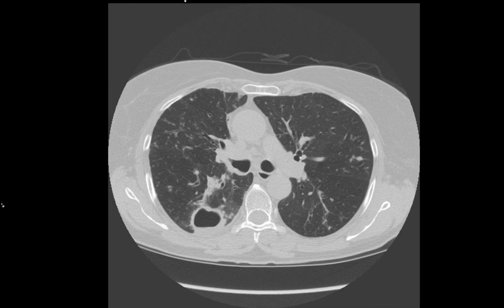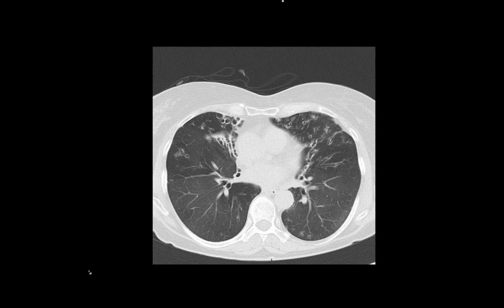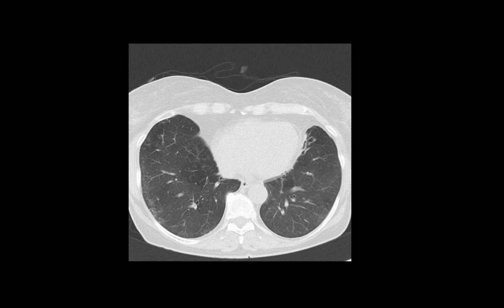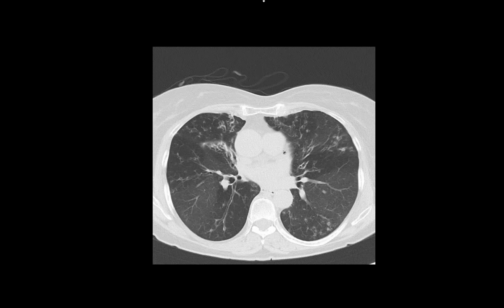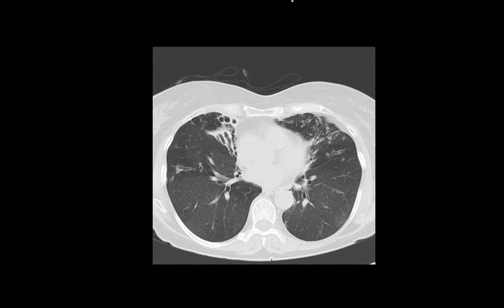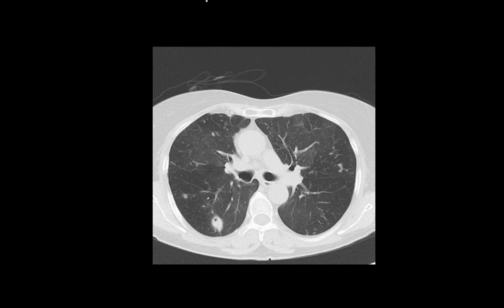Here's a smaller abscess cavity, and before that we had, this is now a few months before, way back in 2011. There was nothing in that location, but there was the earlier finding of MAC. This is 2011 imaging here with a classic middle lobe and lingular concentration of lesions. And here's the earlier precursor to this, what became a cavity.